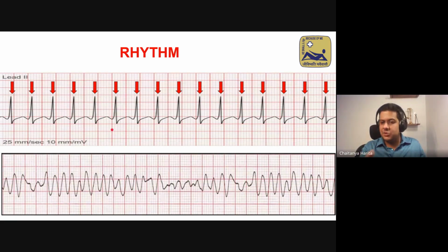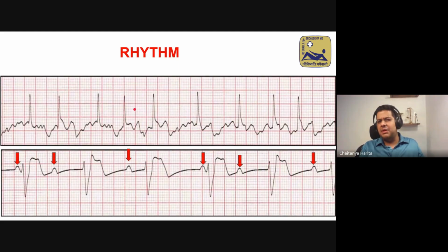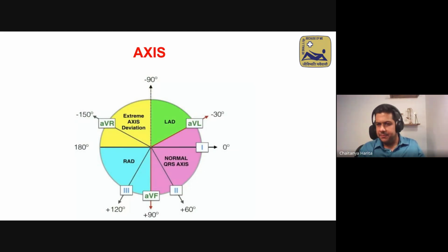This is probably PSVT. The bottom is polymorphic VT. This is basically complete heart block. This is probably flutter fibrillation. So you are looking at abnormal rhythms. The basic point: these are not in sinus. Calibration, rate, rhythm. 3 down, 5 to go.